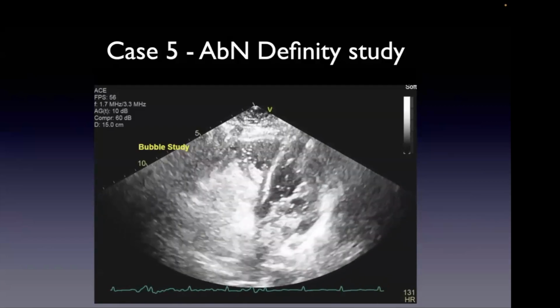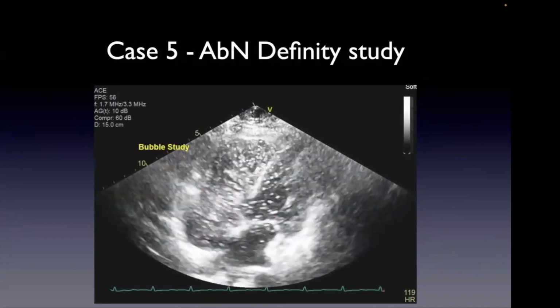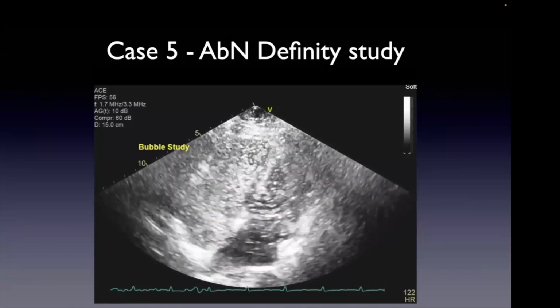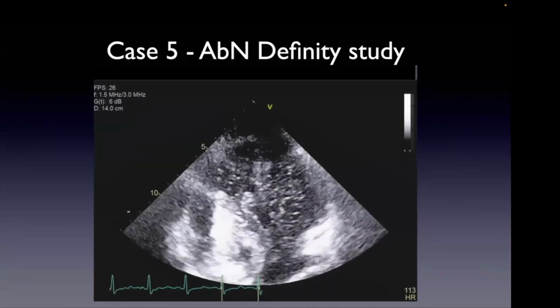It's very large. It's right away. It's very early. Yeah, but there's another reason. The RV. Yeah, exactly. So the RV is dilated. Okay. All right. So this is one for Dr. Chow, because Dr. Chow is here. You'll notice the abnormality in the contractility of the right ventricle. You see it better on the contrast there.